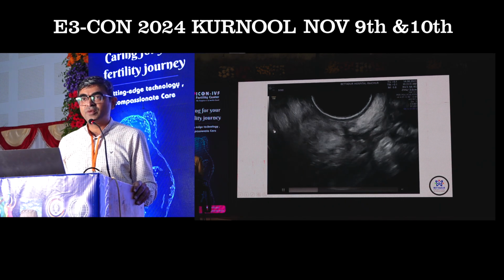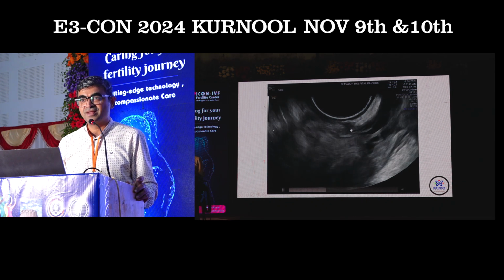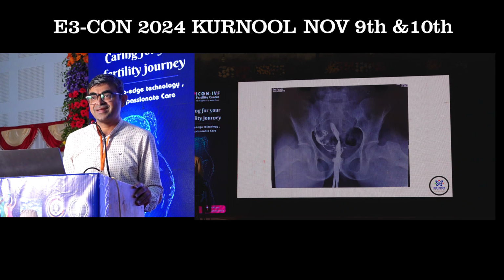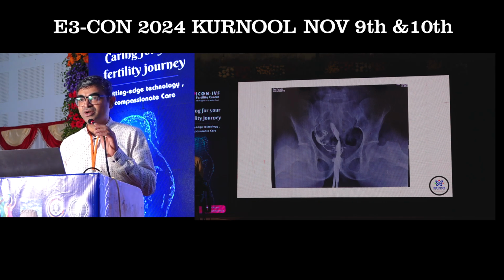Now to wake you up from the post-lunch session, what is this abnormality on HSG? How many for unicornate uterus? No, please answer. So rest all believe that it is not unicornate, right? Any differences of opinion anybody wants to say?